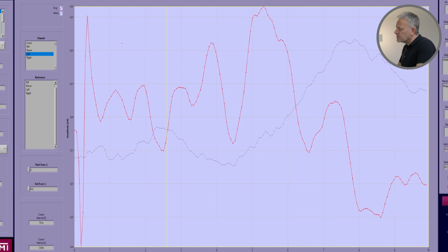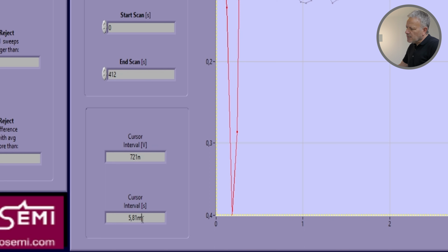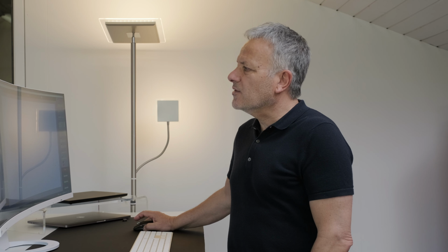It lasts to about, I'd say, to about here. That's where the stimulus artifact goes back to zero. Straight after that, following is our waveform 1, our waveform 2, 3, 4, and 5 right here, I would think. So let's place this marker on the front, because this is our left marker. Let's put this time marker on where we believe is 5, which is around here. And looking at the timing, I can see a delay of 5.81 milliseconds, which is absolutely in the green. We can say this is waveform 5 without the shadow of a doubt.